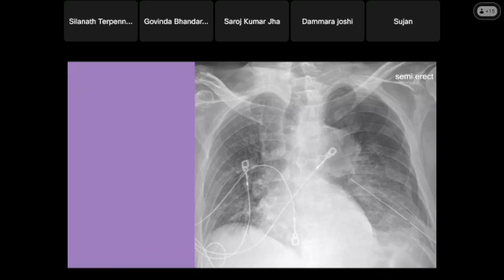So that's why, when the baby is in exhalation, the trachea will move toward the right. That is considered normal. But in young people like you, it should be right straight in the middle. But when we get older, it's going to shift to the right again because the aortic arch is harder than when we were younger. So that's because of the aortic arch.